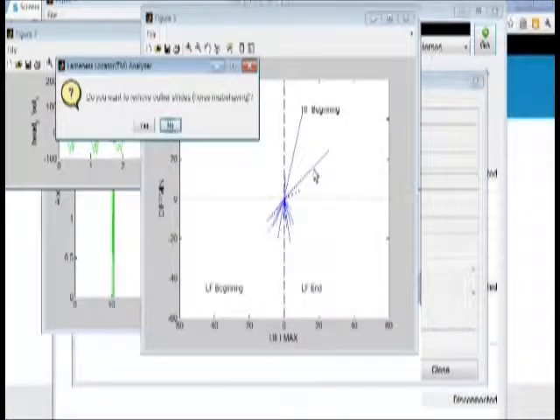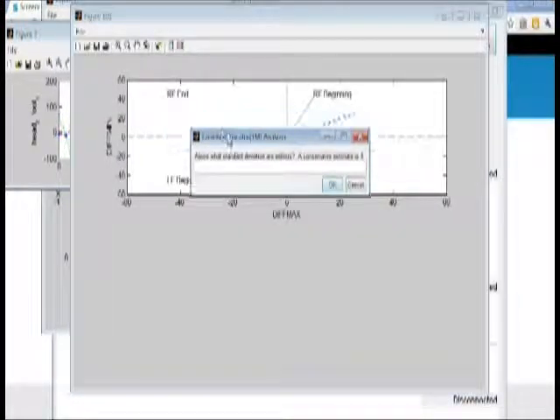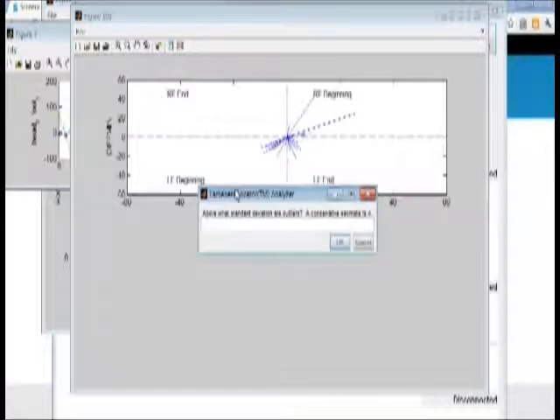As an alternative, the user can remove these few strides. To do this, the user selects Yes. This opens a small text window asking the user to enter a standard deviation above which are considered outliers. The text window can be moved off the default forelimb ray diagram, which is underneath. The standard deviation default value is 100, which will practically accept all strides. A conservative value, one that will remove few strides in few circumstances, is 4 standard deviations.